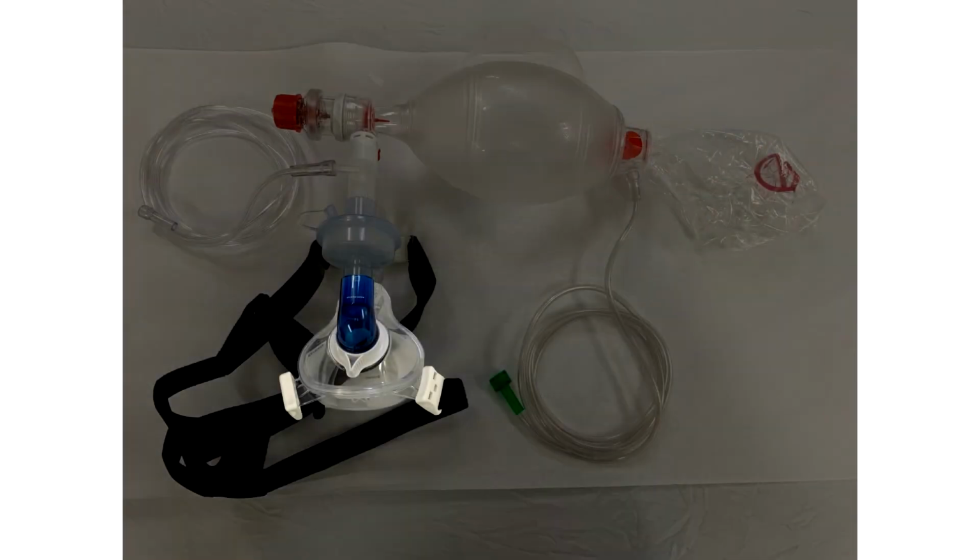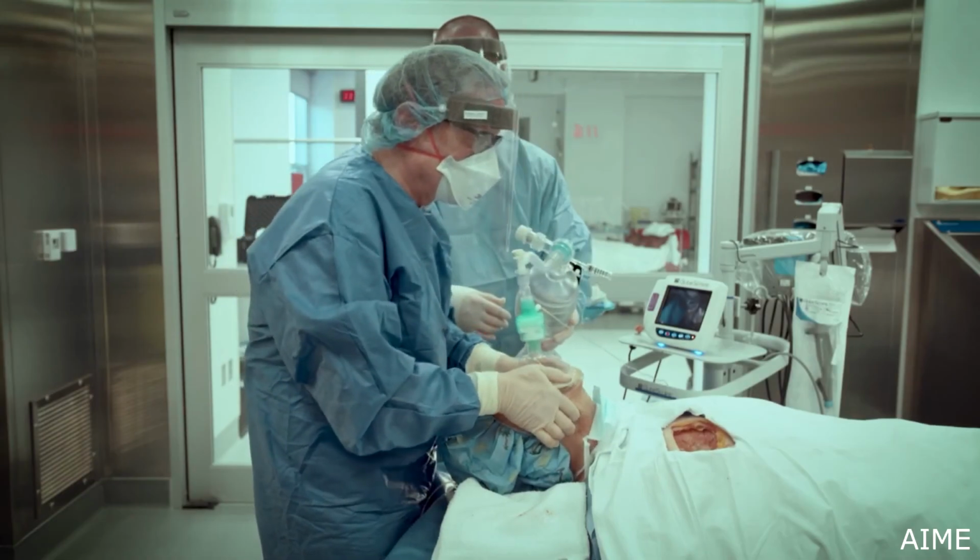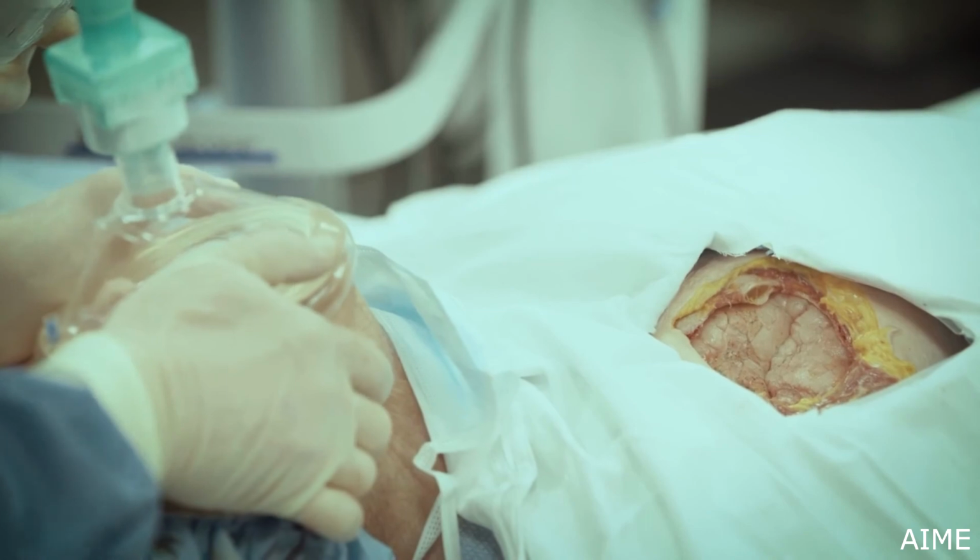While you can use a regular cuff seal mask for this, you might also think about using a non-invasive positive pressure mask because this allows you a largely hands-free setup. You may need to add an elbow adapter or an extension piece to ensure that your system remains closed if you do use these masks. This will allow the setup to be less cumbersome, and you might be able to rest it on the hospital bed or on the hospital tray. Conversely, a cuff seal mask allows for an easier jaw thrust and more control over the seal.